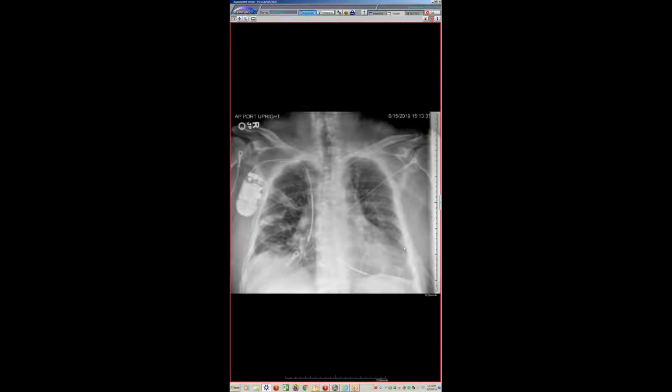So a chest x-ray is a chest x-ray. I mean, there are some peripheral areas of consolidation. Obviously, that changes your differential diagnosis. But beyond consolidation, there's architectural distortion. I mean, these are not new areas. There's scarring associated with it. And then I'll show you the CT, which I think is really one of the nicer examples of this I've seen.